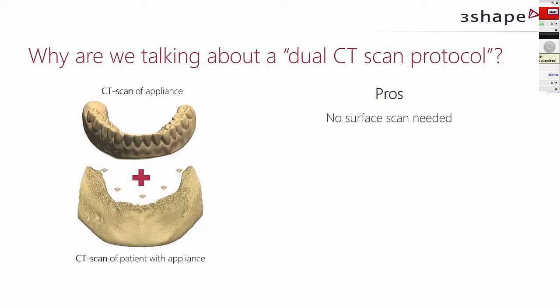But you can say that one of the pros for a lot of users is that we don't need a surface scan source, so we don't need an intraoral scanner or a model scan. We only work with the scans coming out of a CT scanner. It's a well-established and documented workflow within both academic studies and case studies throughout the entire world.